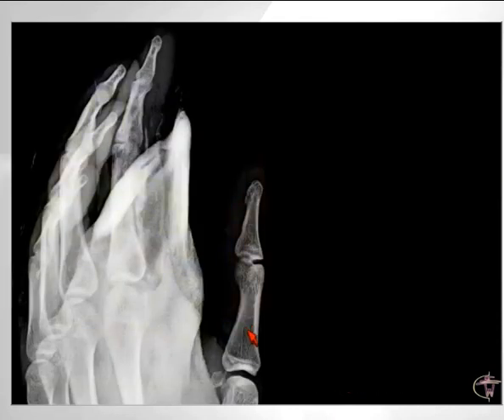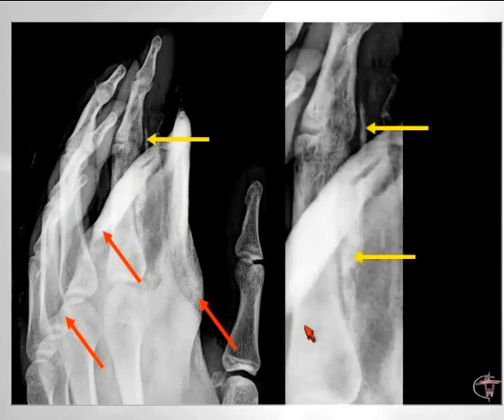And it is not useful if you image your patients with the bandages on. Here's the bandage. Here's a tiny little bit. On a quick look, you might think, well, this is not much paint injected, but the full extent of the injury is only visible when you look really, really carefully through the bandage. So take the bandages off if you are confronted with such a patient.